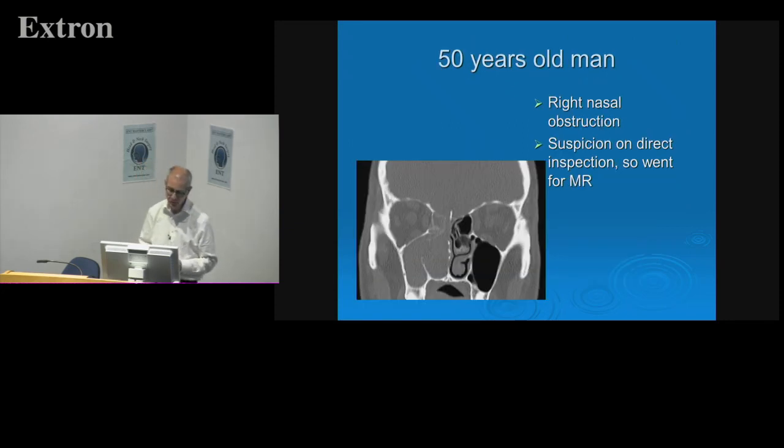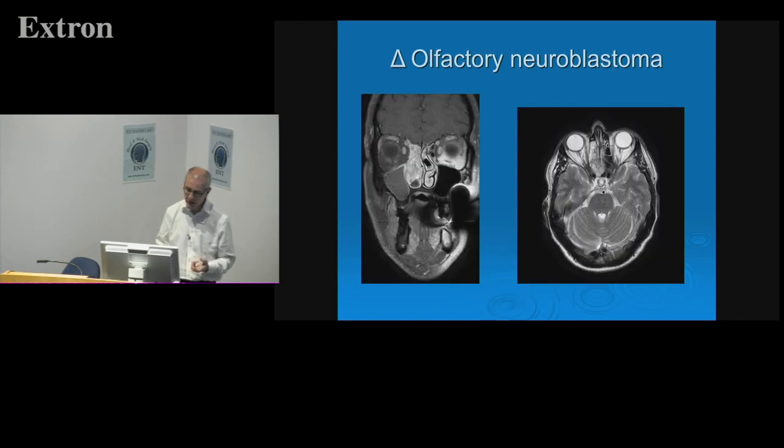Okay, so here's a typical, not unusual kind of CT, but there's bone missing. Get nervous. When you can't see bone on a CT of the sinuses, get nervous. Start thinking about what could be there. And if you have any suspicion whatsoever about these cases, if there's anything unusual when you look, we need to be doing MR. And if you do MR, then you might find something like this.